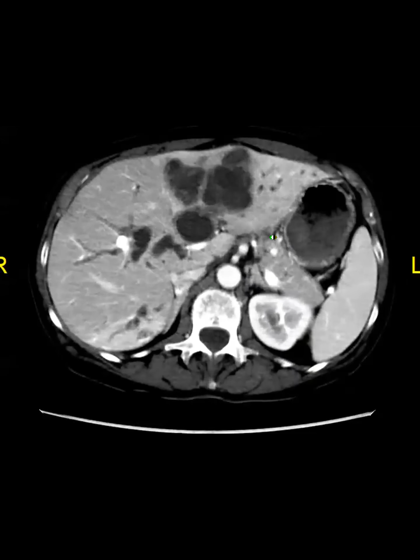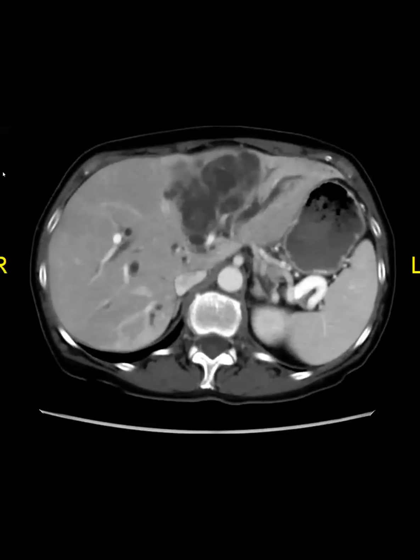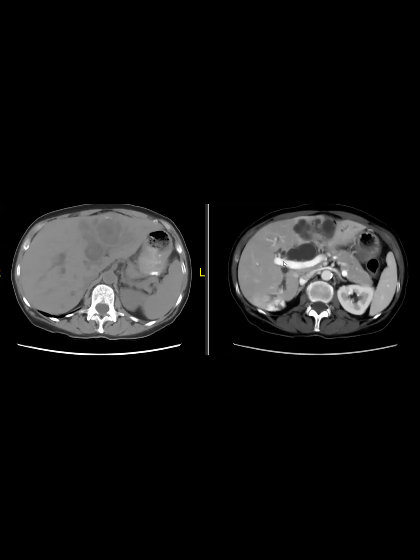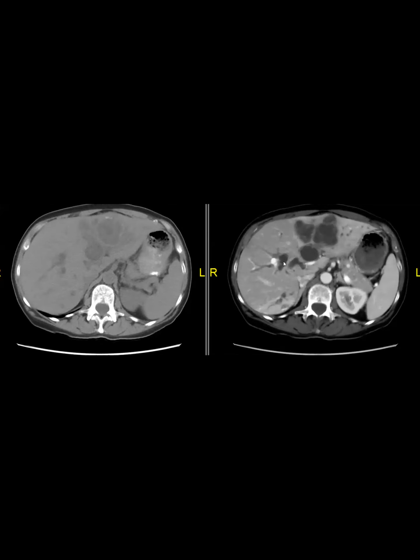So this was an interesting case. You can see this is a woman in, I forget, around middle age.